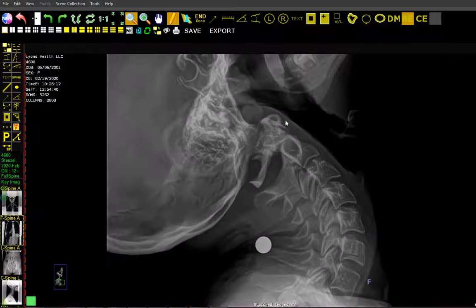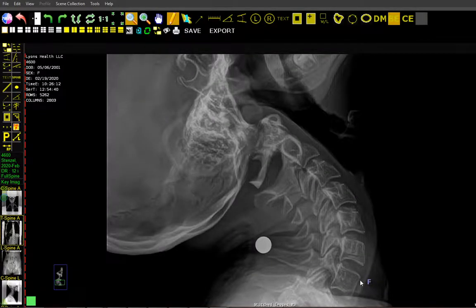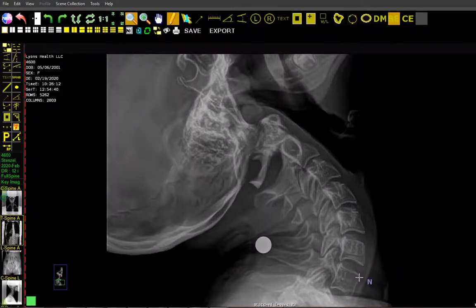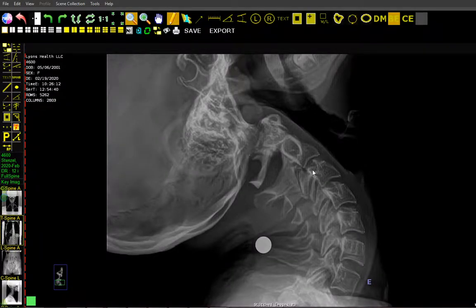I chose these 2 points, and you can see here that flexion pops up. Flexion is the default when you do this on all the films, so flexion obviously you don't have to change, but then if you hit the N on your keyboard when it's highlighted, it'll go to N, and you go to E. And so now we have them all filmed, all marked appropriately.